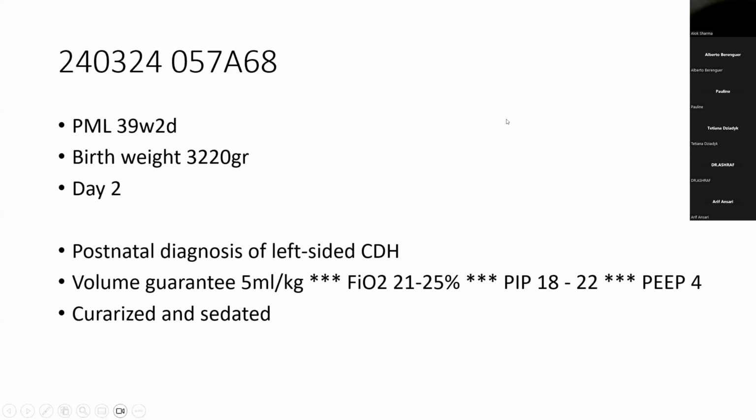So I want to present a case from a term baby with a good birth weight that I saw for the first time on day 2.